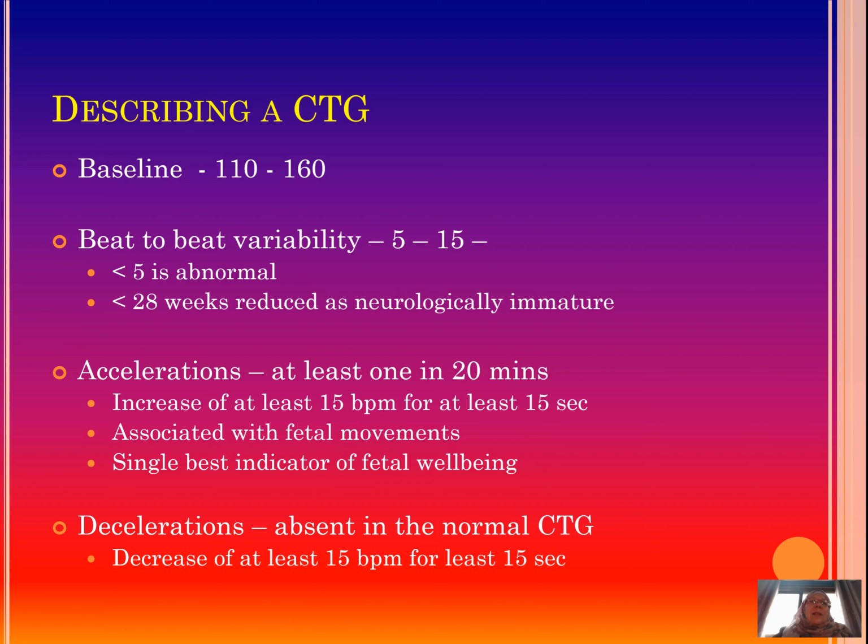Finally, you see decelerations, and these are absent in the normal CTG. So a normal CTG by definition has no decelerations, but it is a mirror image of the acceleration. So it is a decrease from the baseline of 15 beats per minute for at least 15 seconds.